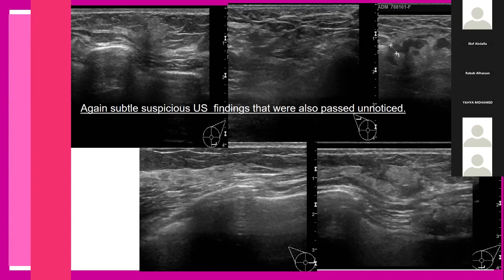So it is disproportionate locally within the same axilla and disproportionate with the contralateral axillary lymph node. So at least it is a pathological lymph node. And there is subtle perinodal edema with increased echogenicity in the surrounding tissue that reduces the fat tissue differentiation and its margins.